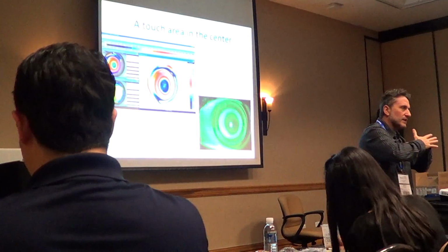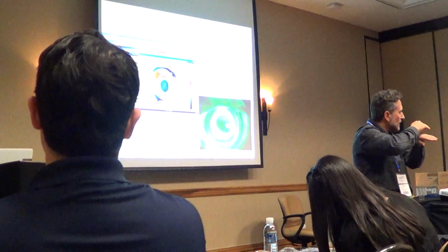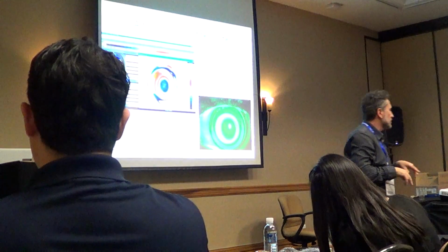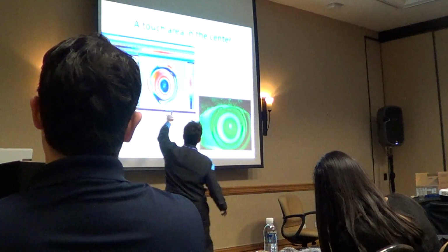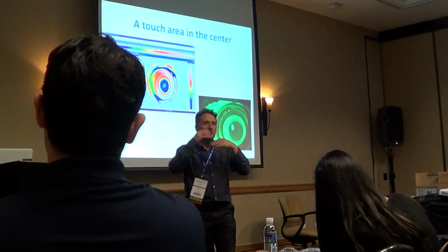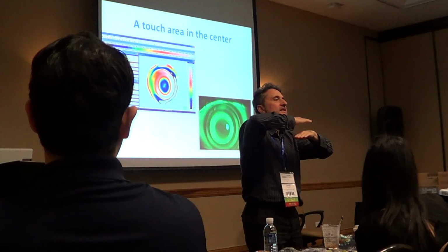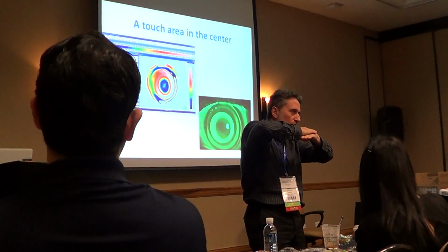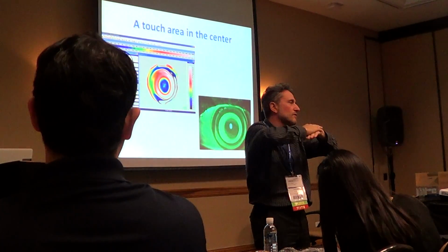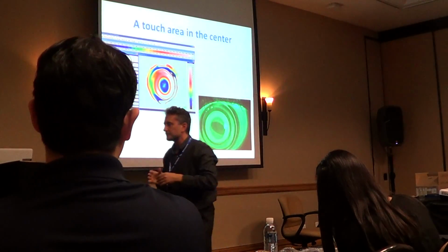And this is created because we have some inflammation on the epithelial central cornea. Because we have contact that creates inflammation, and that creates a small bump there that the topographer thinks is an under correction zone. When you see on the topography differential map a zone of under correction, in my opinion, you should increase the sagittal height of the lens to create some space between the back optical zone of the lens and the cornea, around 5–10 microns is enough. But you need to do that.